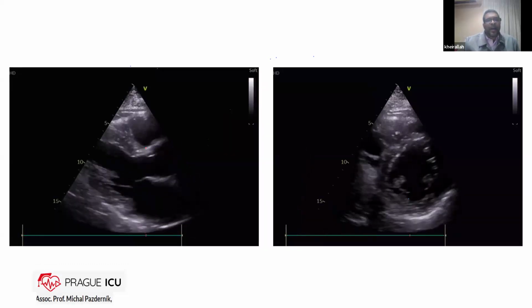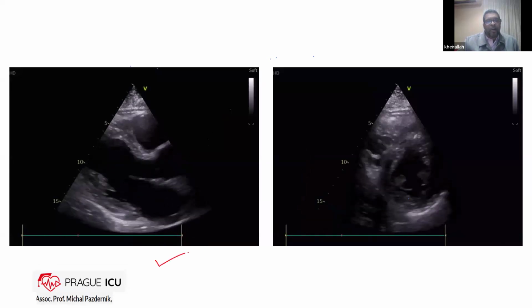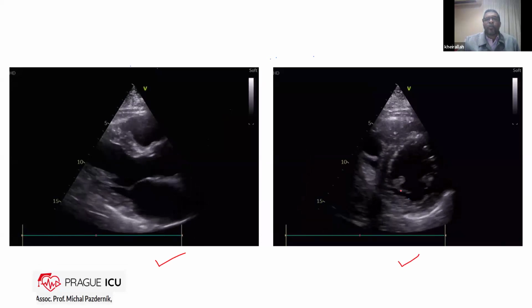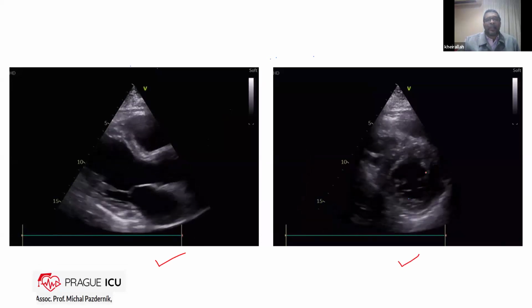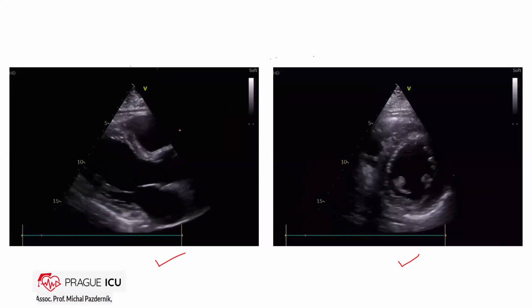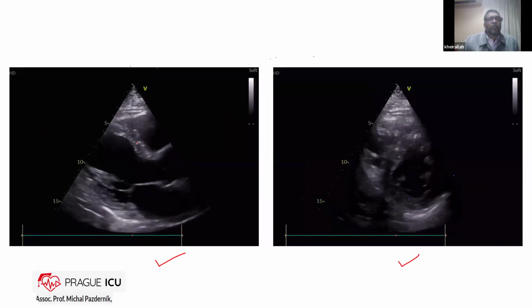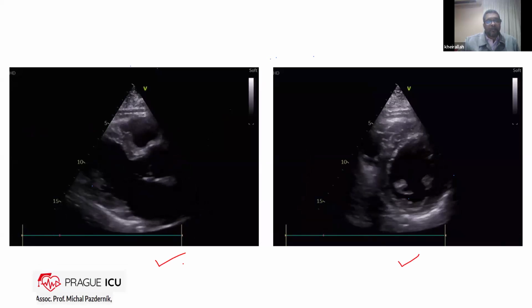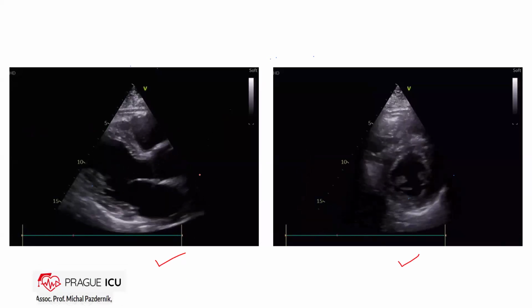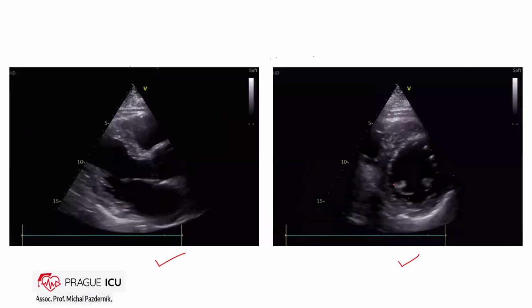And what do we have here? Parasternal long axis and short axis. This short axis view is at which level? The level of papillary muscle cavity level, yes? So what's your interpretation of the regionality here? Inferior wall hypokinesia, short axis.